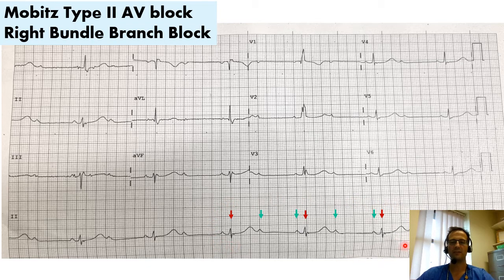If I saw a little bit of this on a 24-hour ECG, I might arrange an urgent outpatient pacemaker. If you've got a highly symptomatic patient or you found it on a resting ECG, I'd be thinking about an admission, because I'd be worried about higher degrees of block happening. So very important to spot this and to offer a pacemaker. The other thing to think about is thyroid function. Sometimes this can be a sign of profound hypothyroidism.